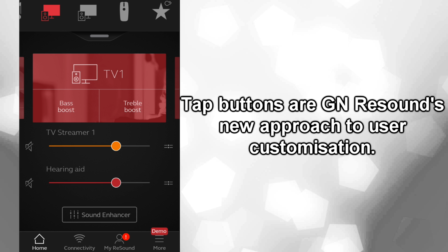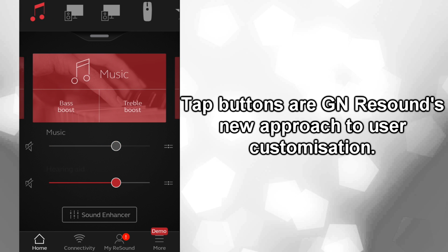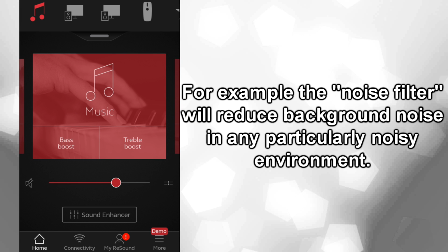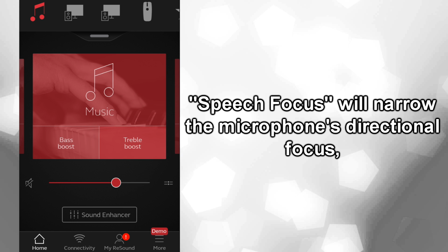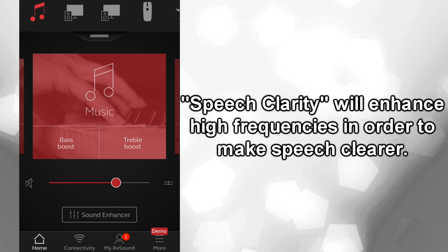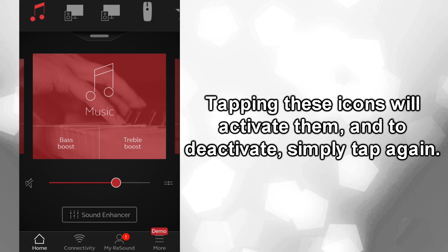Tap buttons are GN Resound's new approach to user customization. With the touch of a button, users have options within the programs. For example, the noise filter will reduce background noise in any particular noisy environment. Speech focus will narrow the microphone's directional focus, allowing you to listen to only the person or people in front of you. Speech clarity will enhance high frequencies in order to make speech clearer. Tapping these icons will activate them, and to deactivate them, simply tap again.